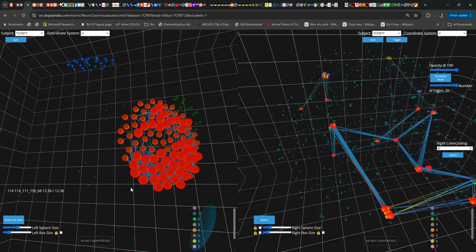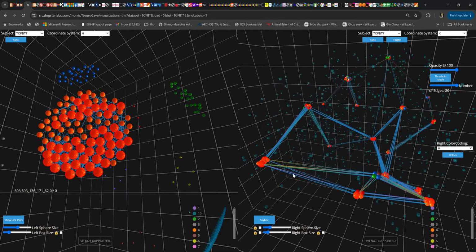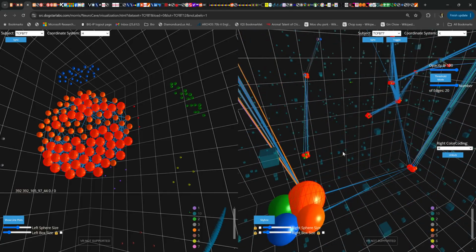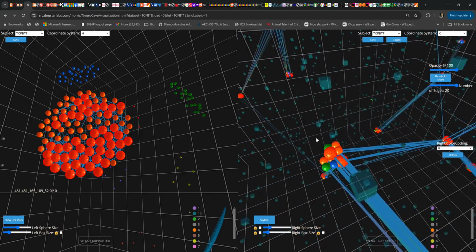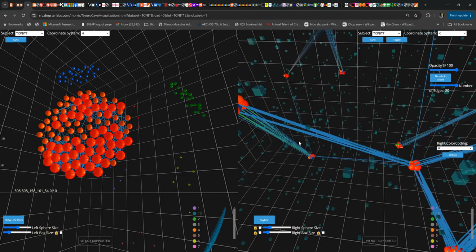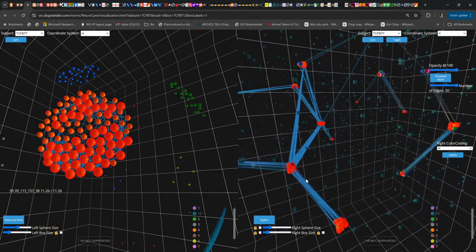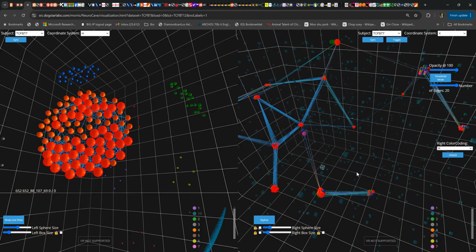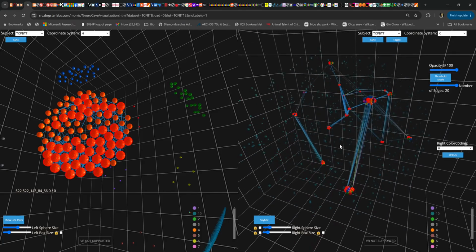So selecting all the nodes in one cluster on the left, we can see the network map of how a specific cluster, which kind of represents a cell type, seems like it has a presence in pretty much all of the tumors there. So that cell type is shown to be ubiquitous among all the tumors in this patient. I don't really see any tumors that don't have any of the cell type in it.